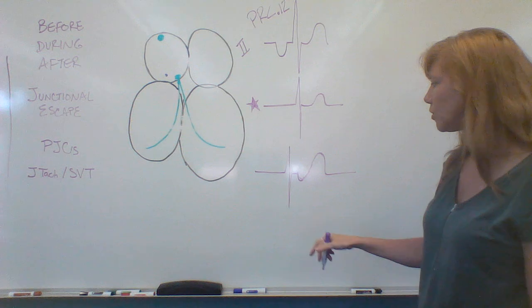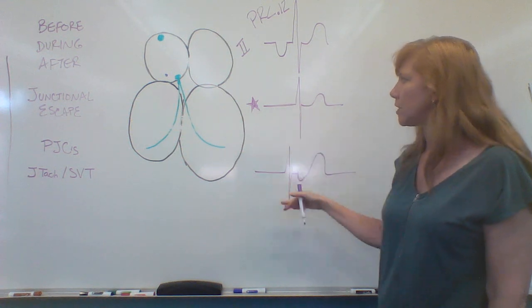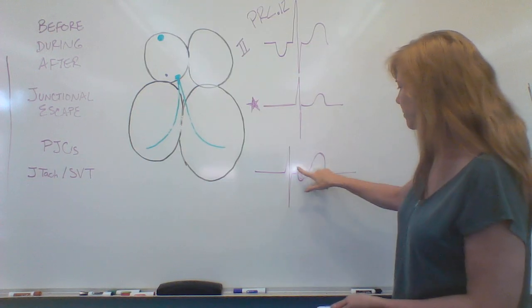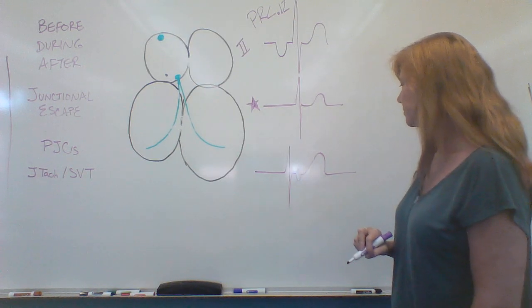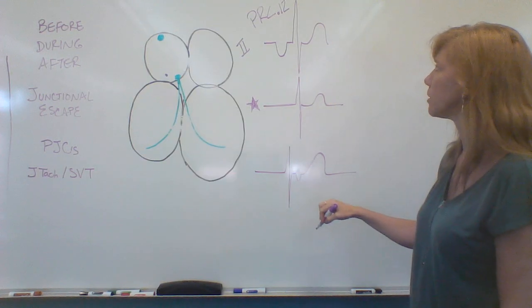In which case, you just think that there's no P, and you still think it's junctional. So you'd still call it the right thing. So it's not that big of a deal. So not very common, but sometimes we see it. So P can be before, during, or after.